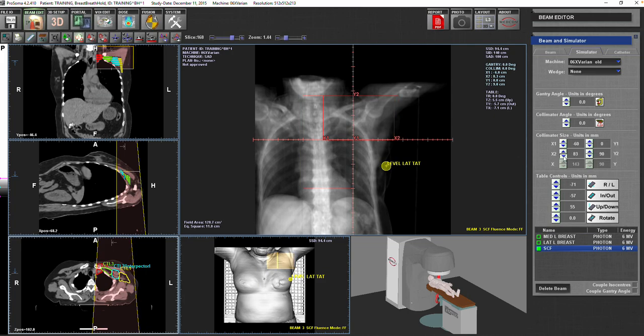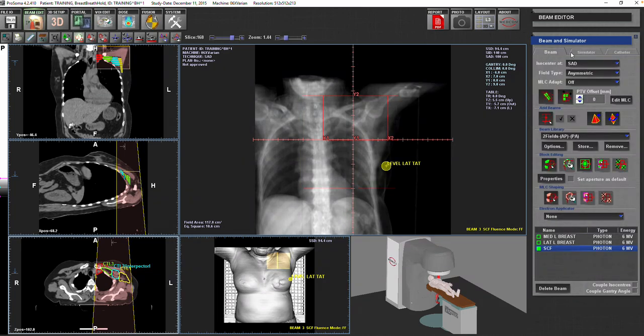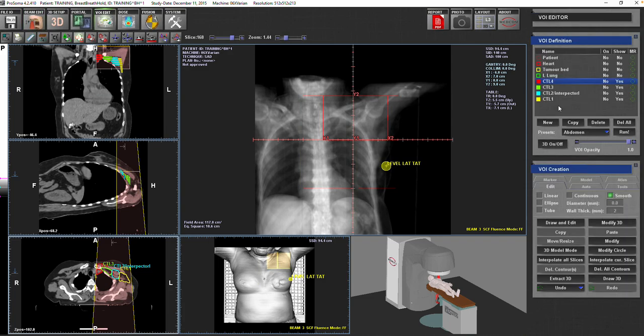By the way, I'll tell you now that it's not necessary to be 1 centimeter, but this is, for example, 60. I will move it to be 65, or maybe if you want to do it 70. The good thing about this now is that if I open my CTL1, I can see that, okay, this is covered or not covered.